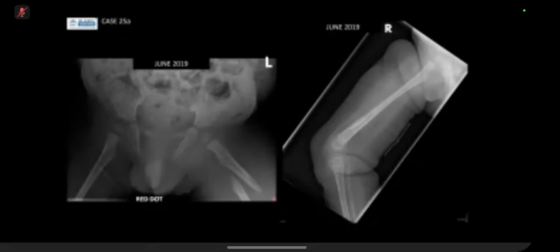Now, you wouldn't be able to tell it from the first instance. All you can say is that there is a displaced fracture on the left and periosteal reaction suggestive of a fracture, but an underlying soft tissue or bony process, malignancy cannot be excluded. Do an MRI to characterize, but I think on the other view, which I may not have shown, there was a cortical fracture with evidence of healing.